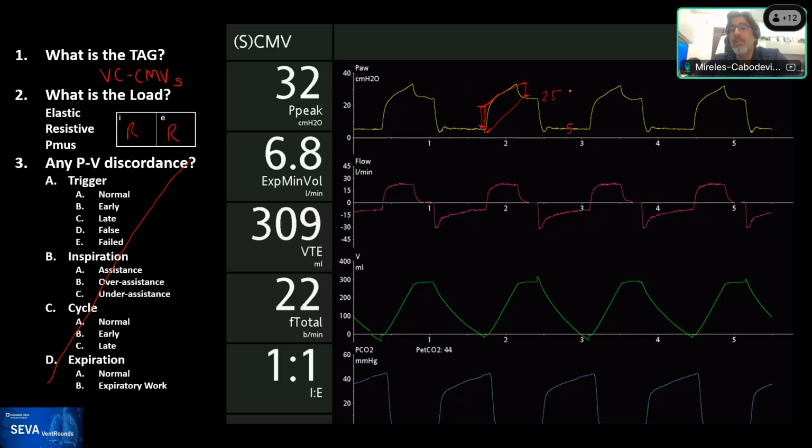All right. So the driving pressure for this patient, according to this measurement, is... well, actually, right now Rob is going to slap me three times because he's going to say that's not the driving pressure, Eduardo. Anybody want to write it in the chat? So we know one is the P plat minus the... Excellent, Lee. Minus the total PEEP.